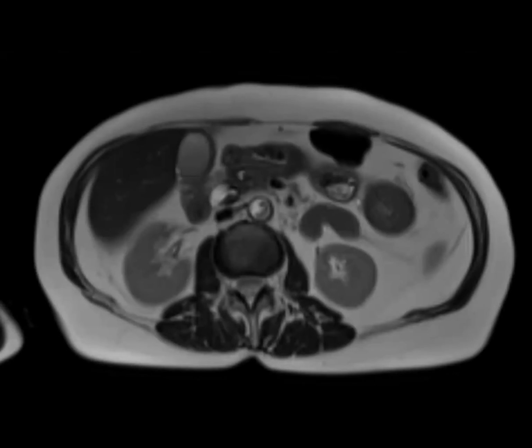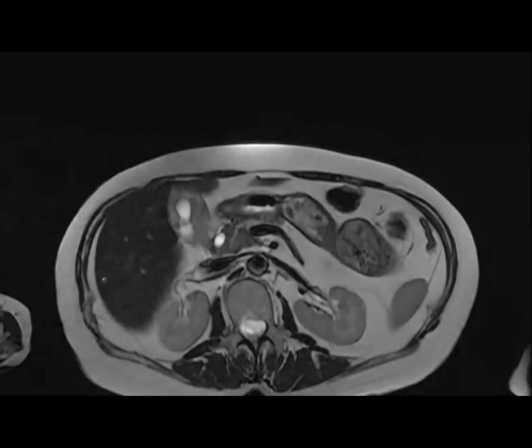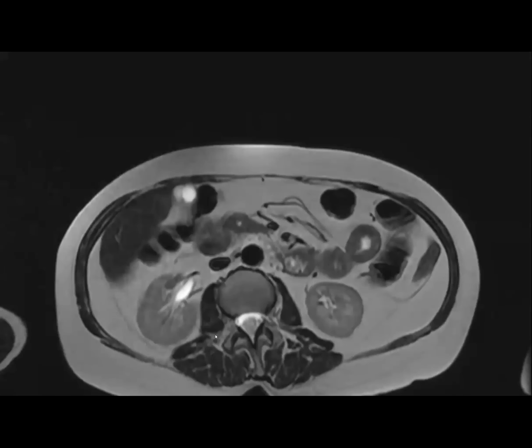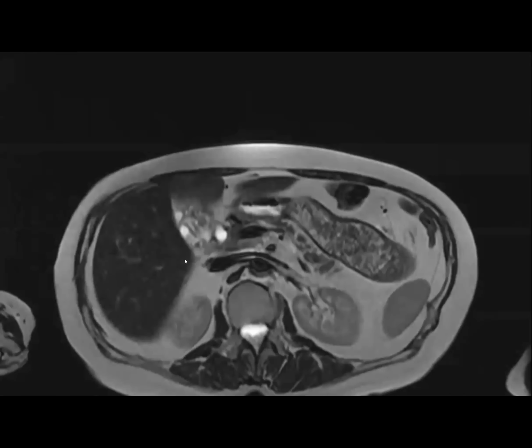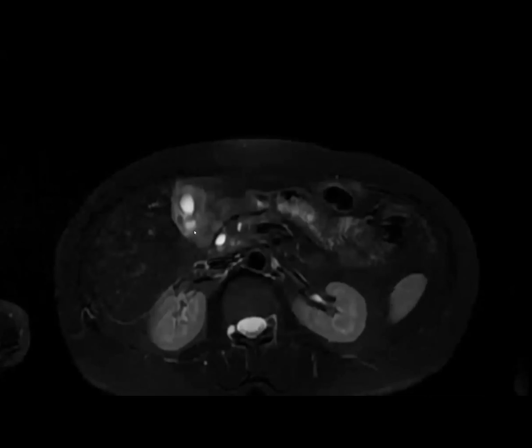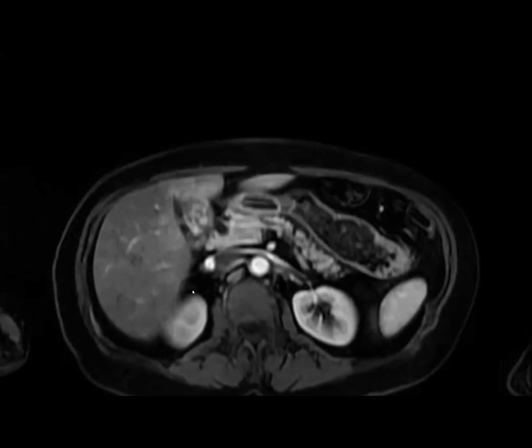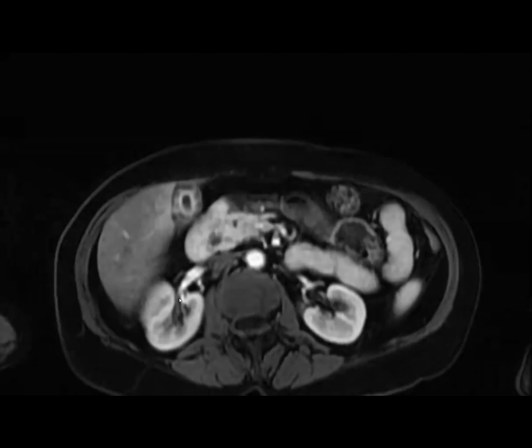Okay, 7 months goes by. The patient comes back, and this is what their gallbladder looks like now. Ugh. So we still have those cystic spaces, but now we've got this thickened T2 hyperintensity. Evil gray. Yeah, evil gray, but I will show you a couple more. Okay, this is what it looks like post contrast.